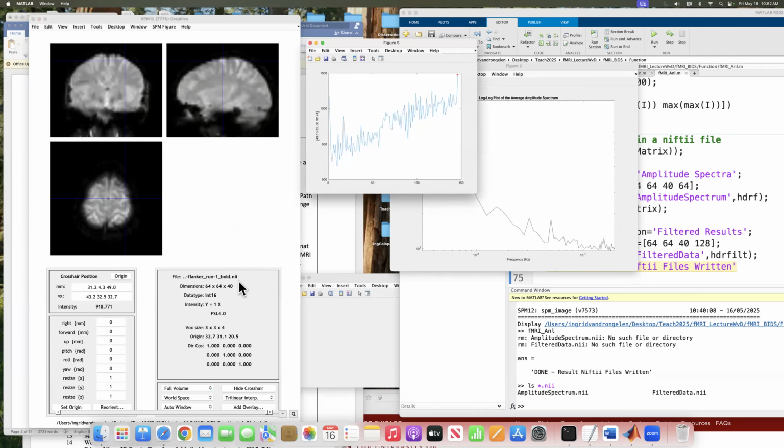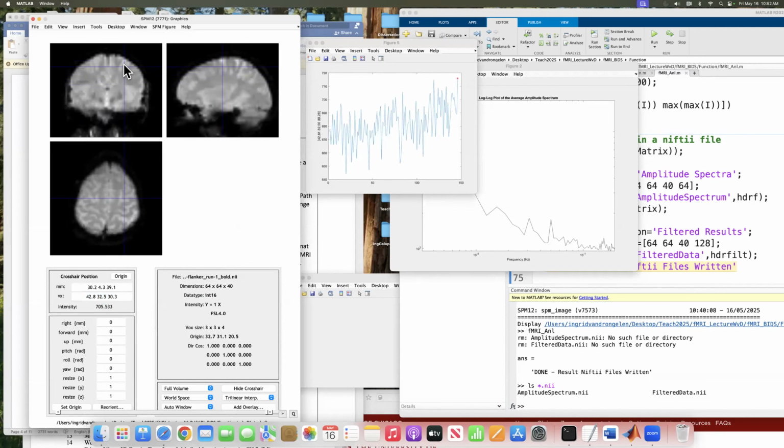And now you can see what the signal is at this voxel. This is the voxel that you are looking at, voxel at 43.2, 32.5, and 32.7. Of course you should round this to get real voxels, because voxels are integers, but apparently this is not exactly the position here. You can also type in a number here if you want, or you can just move your cursor to a different voxel.